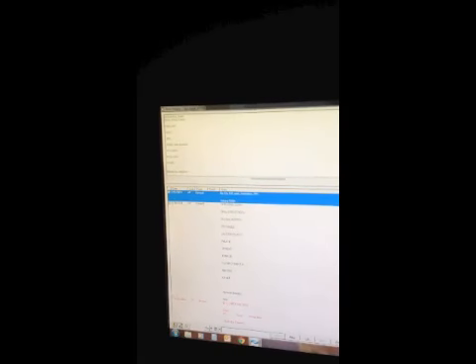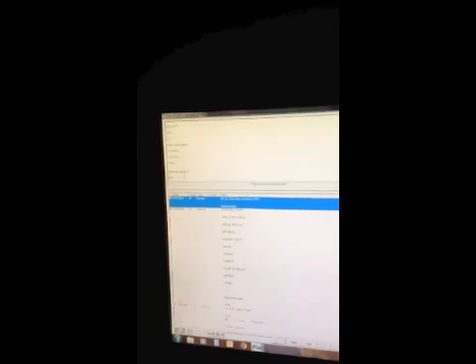If you do find anything, it's the same as your written chart where you write the information, its location, its size, borders, consistency, etc. Once you're done with your extraoral exam, you can type out your name where it says SCH. Always make sure to type out your full name. When you're done, come over to the right hand side and click OK. And if there is no spelling errors or words that the computer does not recognize, it'll come right down.